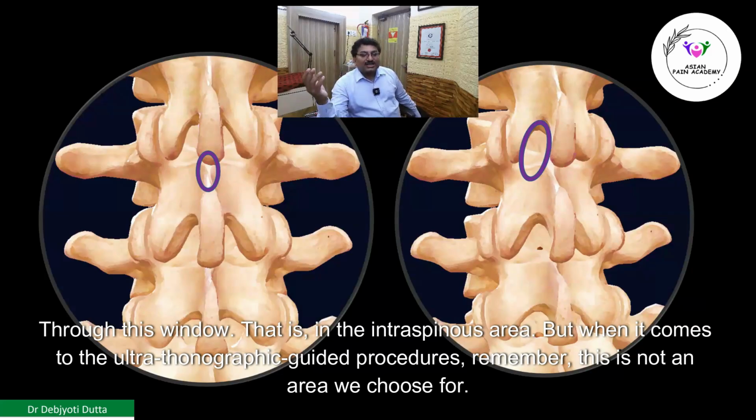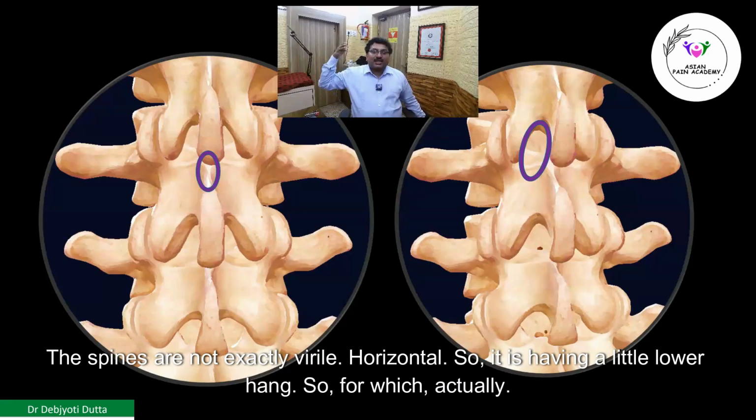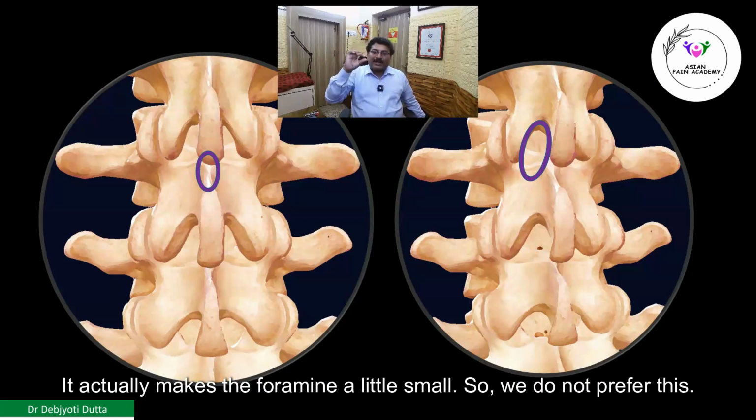But when it comes to ultrasonography guided procedures, remember, this is not an area we choose, because here the lumbar spine is projected and this area is a little bit obscured because of the hangover of the spines. That means the spines are not exactly horizontal. So it is having a little lower hang, which makes the foramen a little small. So we do not prefer this window.